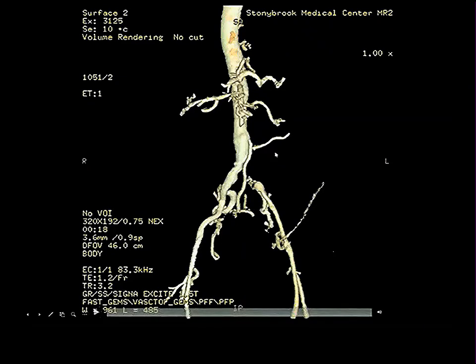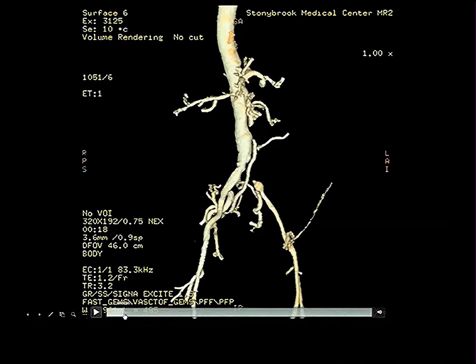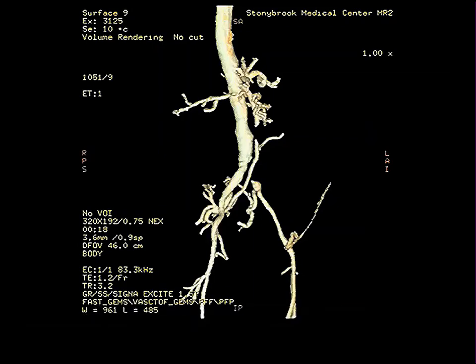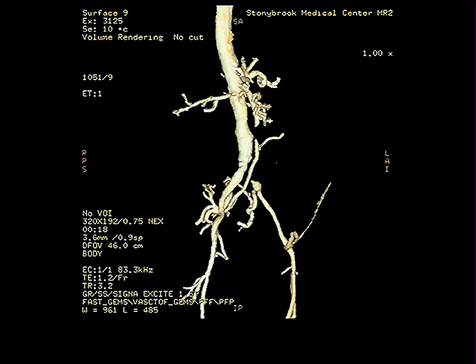All right. Remember this thing up there? So that's one thing that is right. Person said common iliac occluded, left side is right. Anything else out here? The IMA occluded as well? Perfect. The IMA is completely occluded at its origin, right here. It's being filled by the marginal artery of Drummond or the arc of Riolan. All right? But it's not getting anything from the aorta. So it shows you that anastomosis can fill vessels that are not being fed normally. There's also a little kink right up there at the top in the left renal artery as well.